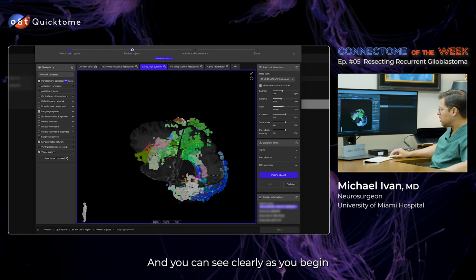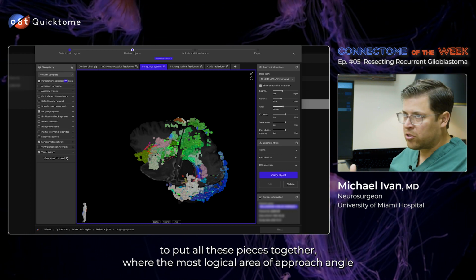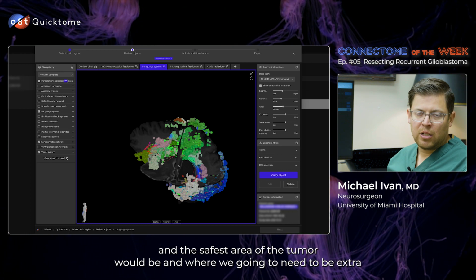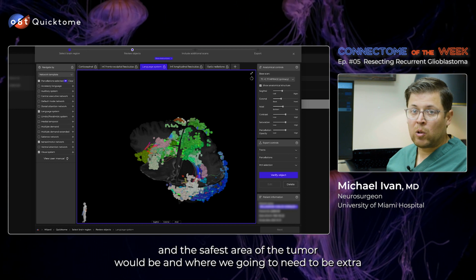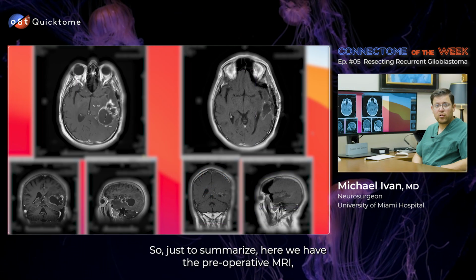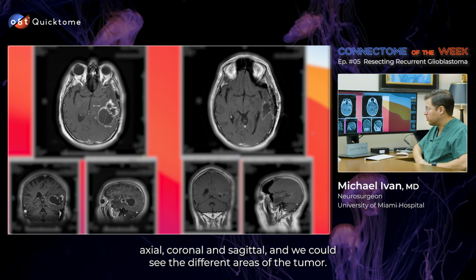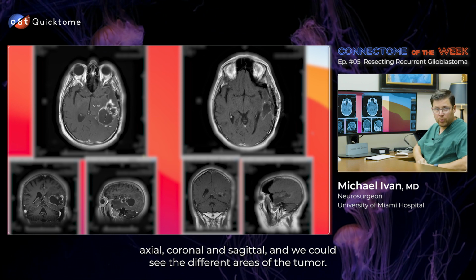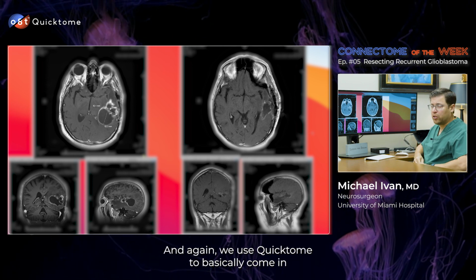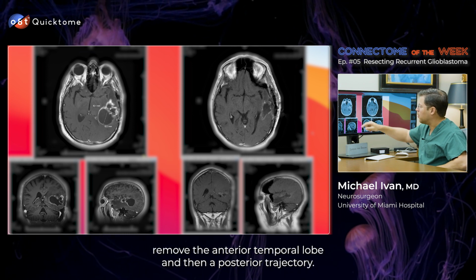And you can see clearly as you begin to put all these pieces together where the most logical area of approach angle and the safest area of the tumor would be, and where we're going to need to be extra critical with our awake mapping technology. So just to summarize, here we have the preoperative MRI, axial, coronal, and sagittal, and we could see the different areas of the tumor. And again, we use the Quicktome to basically come in through the anterior temporal lobe, remove the anterior temporal lobe, and then a posterior trajectory.